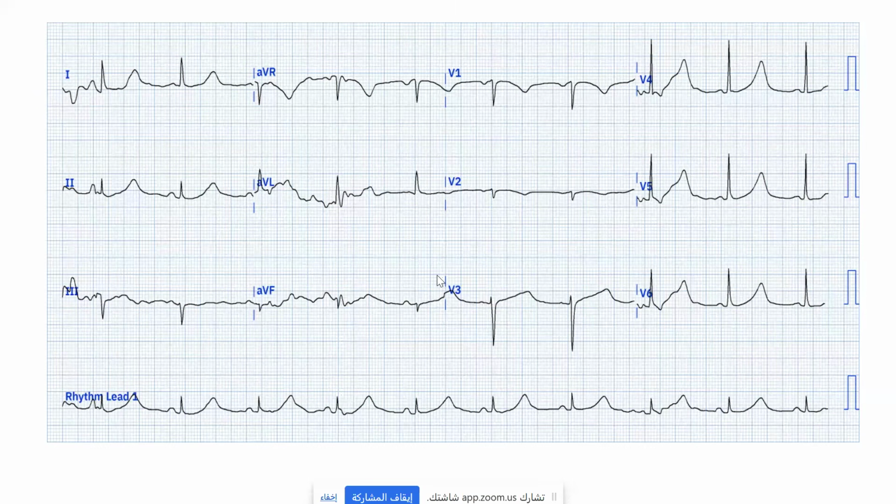Anyway, continue, Doctora. Yes, and this high uptake of the T wave. One of the things here, the T wave is huge, big, maybe tented. And I think you also have a prolongation of the QT. You have a session with Dr. Khairallah. He described how you organize ECG reading step by step. If you apply it to every ECG, you will find that at the end you can read every single ECG.